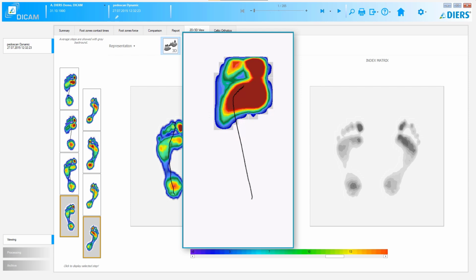The maximum pressure moves across the entire width of the anterior transverse arch from lateral to medial. In pre-swing, the COP is then transferred from the more medial metatarsal bones to the hallux. The last measurable contact is generated by this.